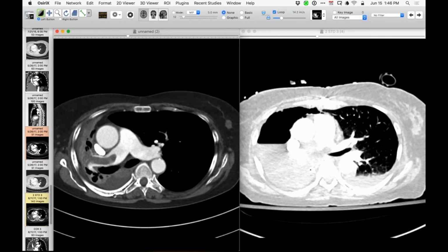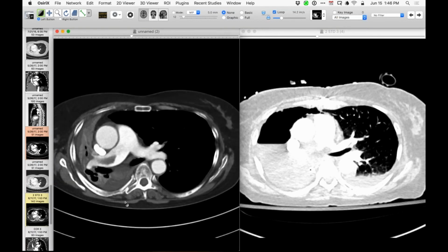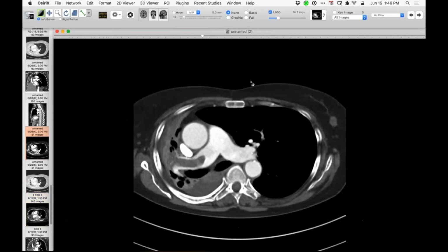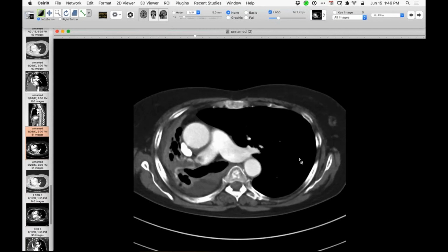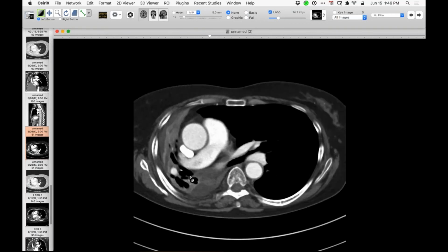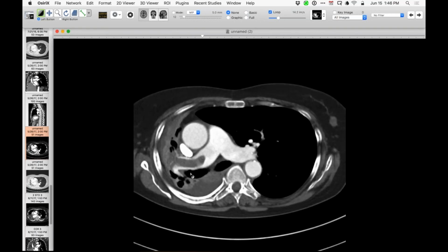But I think you're right, because what also could be happening is the lung normally filtering stuff. It has a nidus to adhere to and not break it down. So maybe you do have some sluggish flow and you just don't have good clearance. I don't know. It looks like it's adherent to that lung distally and just kind of growing up the pulmonary artery. Yeah, it is, isn't it? Huh. So that's kind of curious, isn't it?